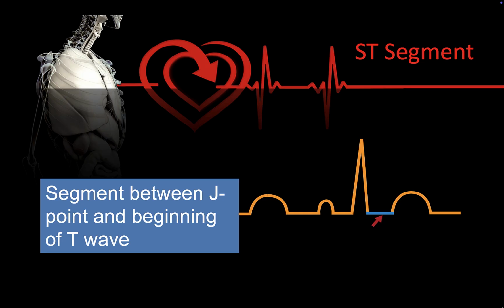That's really not relevant to this discussion, but we do care about how it is positioned in relation to the baseline. Again, in this computer-generated image, the baseline is perfectly straight, and it would be easy to spot if it is above or below that line. In ECGs coming from real patients, there are physiologic changes and abnormalities that may make that a little more challenging.